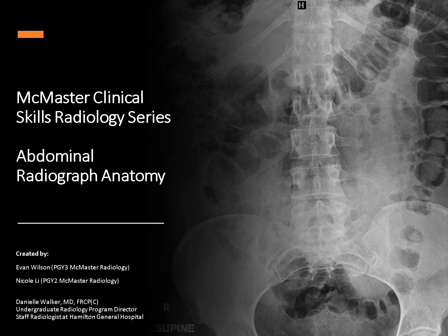Today we're going to talk about abdominal radiograph anatomy. All the images that you see today on this video will be normal abdominal radiographs, so no pathologies. The idea behind this video is just to get a good idea of what you're looking at on an abdominal radiograph in terms of anatomy before we move on to our pathologies video.